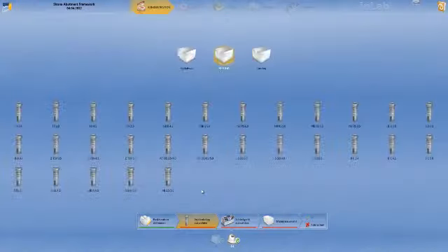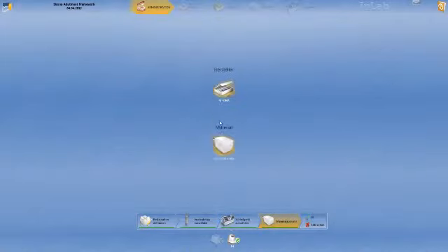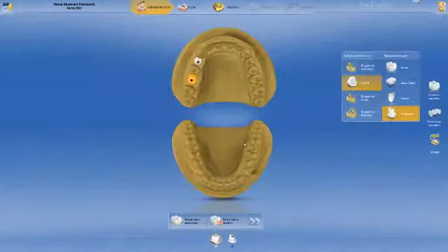Implant type: Nobel Biocare Replace System 4.3. Milling unit for creation of the mesostructure. Material selection: Sirona Incaris ZI Meso. Administration concluded. The next stage is scanning.